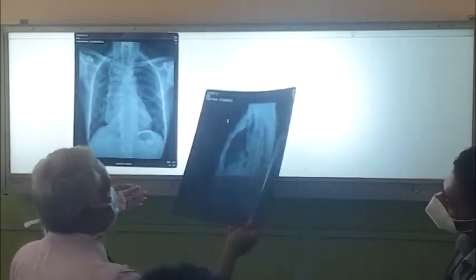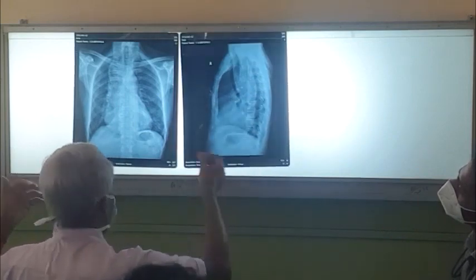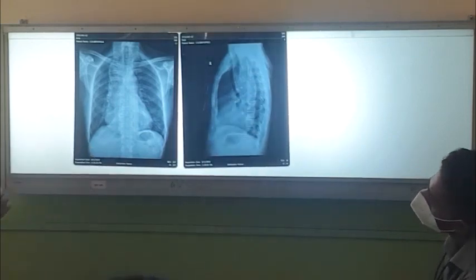This one just remember, right? This patient came with this stage. If you see this patient, this kind of X-ray, right? What is the diagnosis? Came with this area.